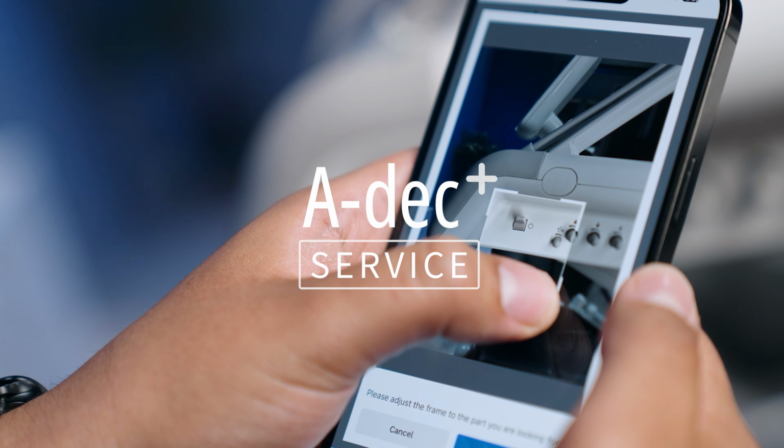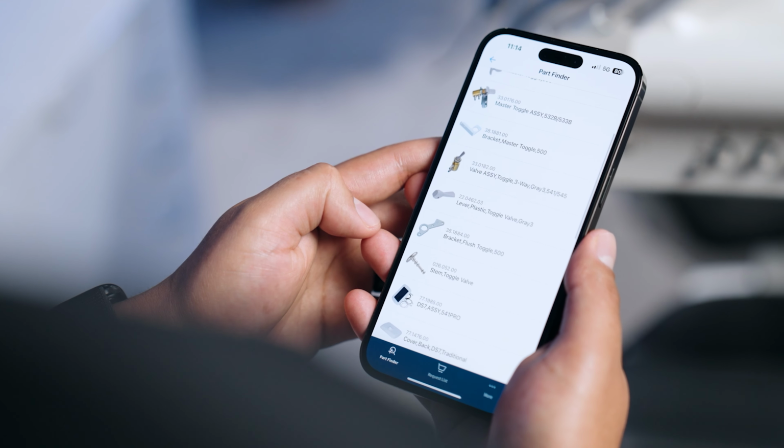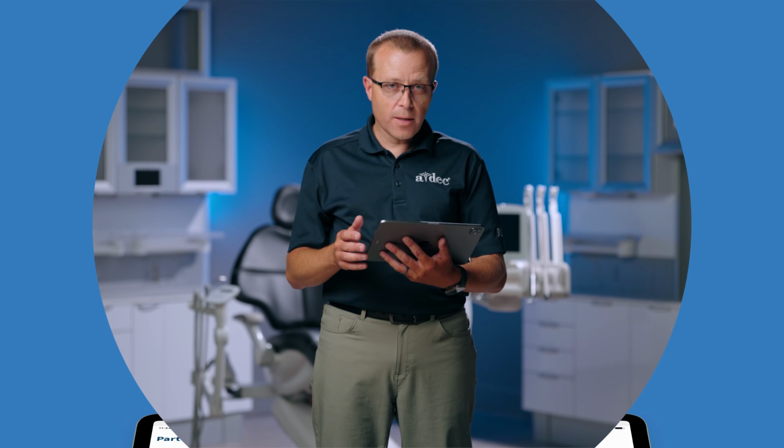I'm from A-dec, and today I'd like to share with you and demonstrate more about our A-dec Plus service app. For those of you who aren't aware of this mobile application, it's designed to help you better identify parts and help you with service. To begin with, I'd like to share with you one of the most popular features of our A-dec Plus service app that allows you to take a picture of a part and use artificial intelligence to identify what that is. And so to begin with, I'll demonstrate.